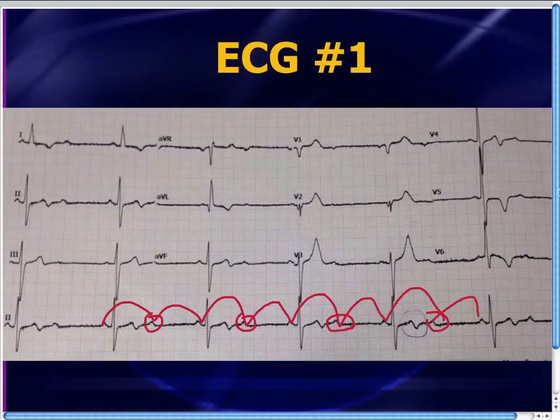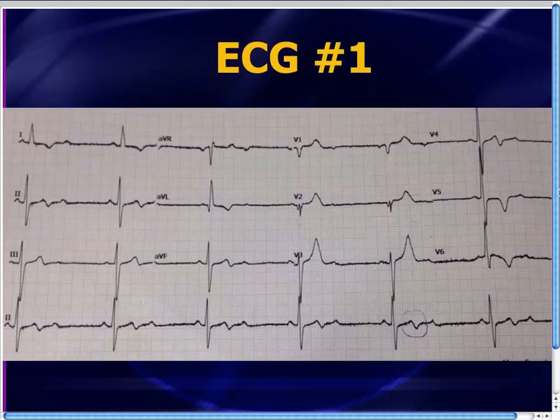So there's sinus rhythm, there are P waves that are not conducted, and when you see P waves that are not conducted, that are mapping out, you're going to be thinking, is this Mobitz 1? Is this Mobitz 2? Or is this third degree? In other words, is this second degree or third degree AV block? How do you tell the difference? Well, you need to look at the PR intervals, and if the PR intervals are gradually increasing, it's Mobitz 1. If they're staying relatively constant through multiple beats, it's Mobitz 2, and if they're randomly changing, then it's third degree.